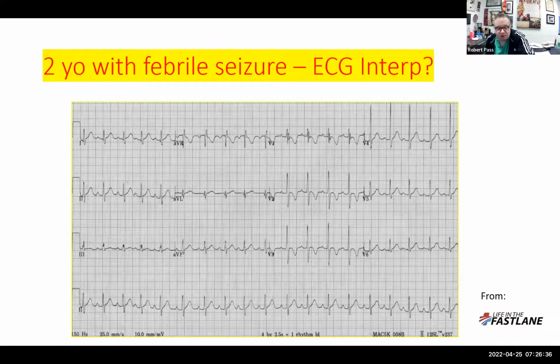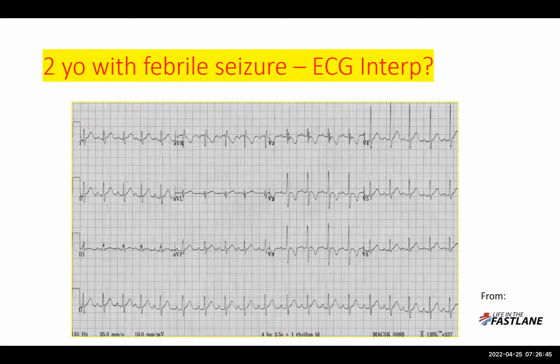Does that worry you at all in lead V1? Is that a normal observation, abnormal? What do we think about that? Yeah, most of the time it could be normal, but sometimes, if the physical exam could be leading, if you have suspicion of ASD, sometimes you can see it with it.